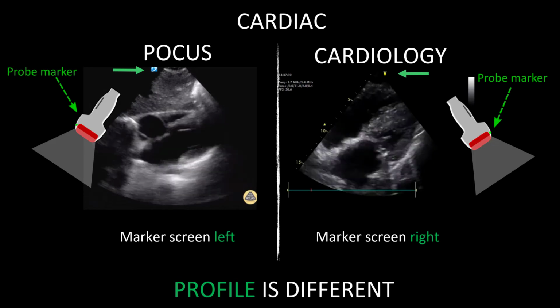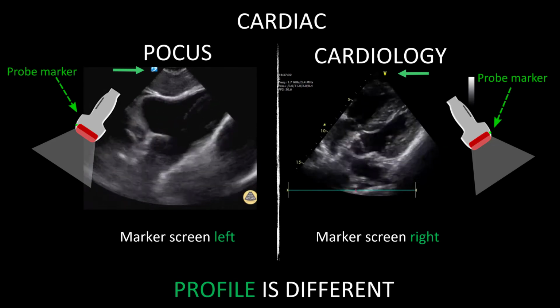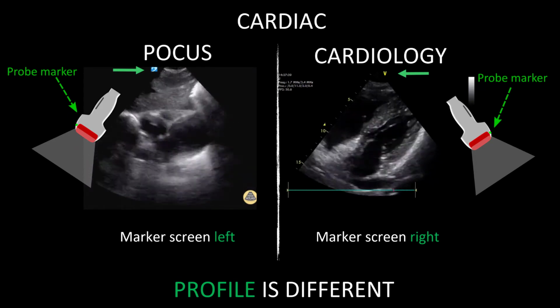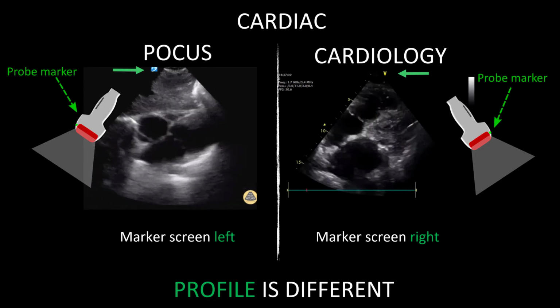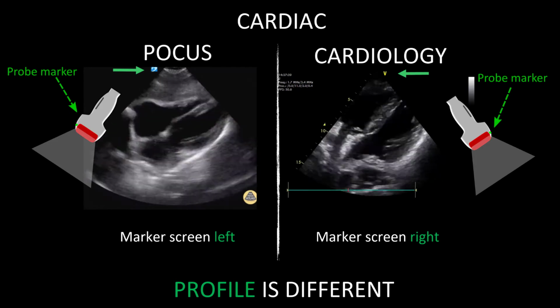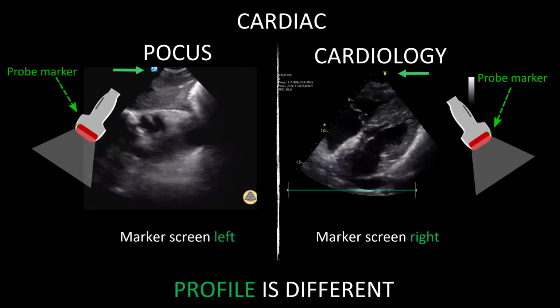This essentially has no consequence on a day-to-day basis, but will require a reversal of the probe if the profile is not switched to a cardiac one. Practically, for cardiac applications, the marker switch is irrelevant as the views are standardized without a direction of probe marker in mind, and usually leads to little confusion if you know what you're looking at and you know your usual views.